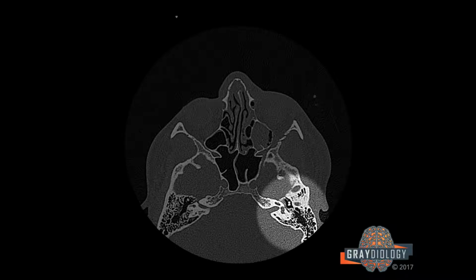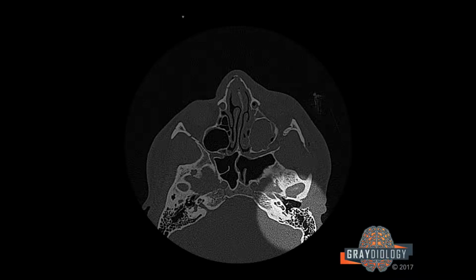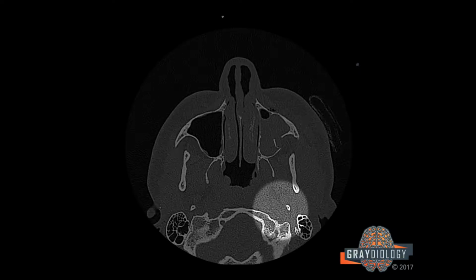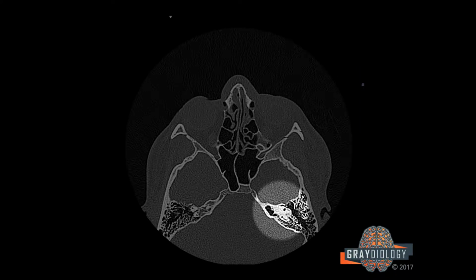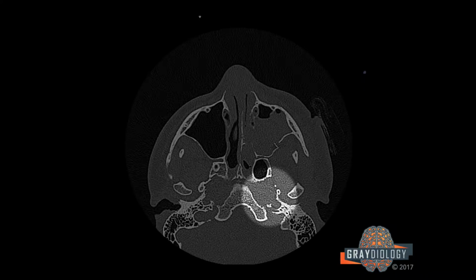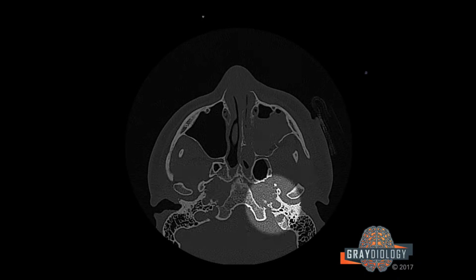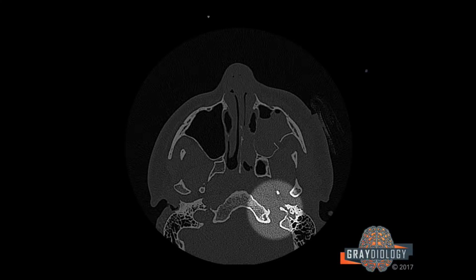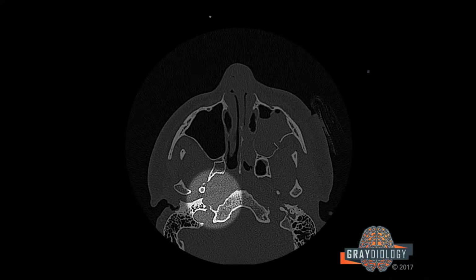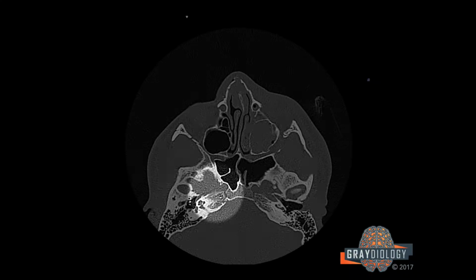The fluid is often localized to where the fracture is and is often linear. And of course, I love my foramina, so after I've looked through the visible temporal bones, I'll make sure to include the carotid canal down through the horizontal and vertical petrous segment on the left, and then the left jugular foramen, then the right jugular foramen and carotid canal.